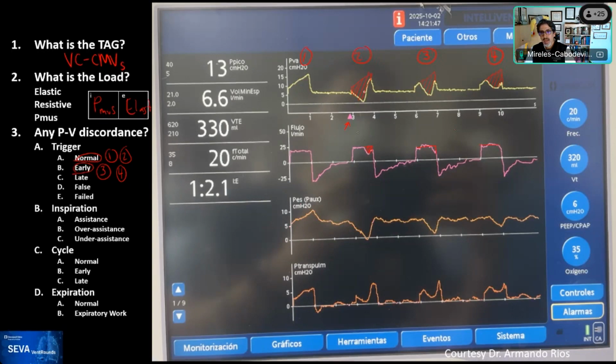similar to the same morphology, if anything, as you see on the pressure waveform from the ventilator, you see how it mimics the waveform over here, and the same for the next one and for the last one. They are essentially, you're seeing the same deformation on your pressure waveform. Rob, comments there?